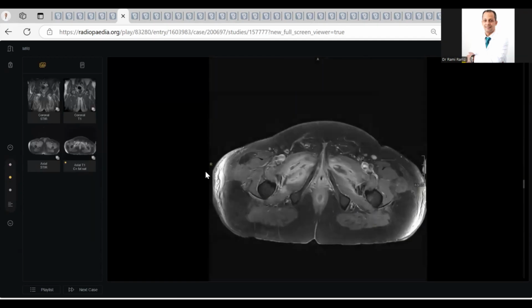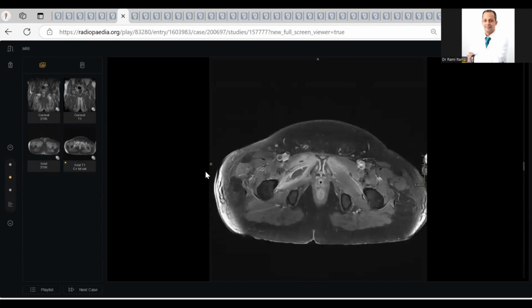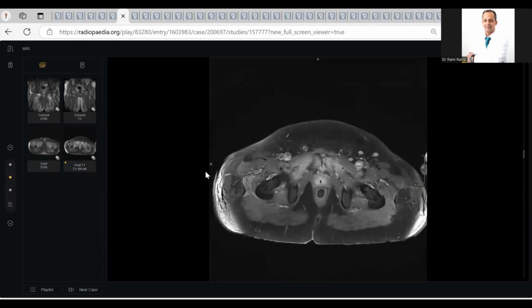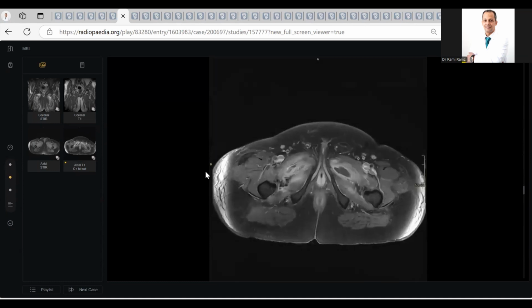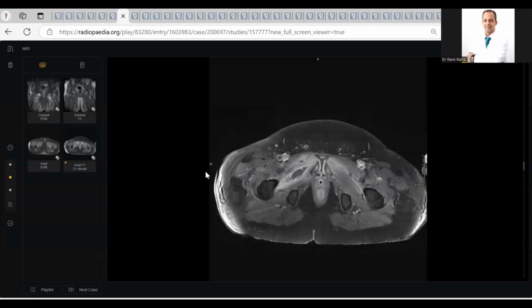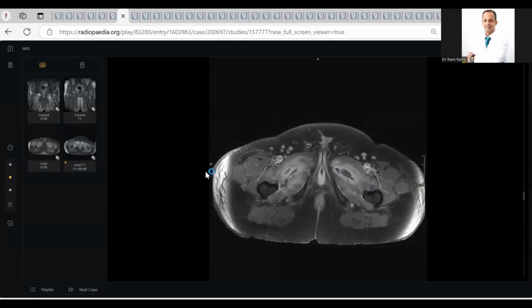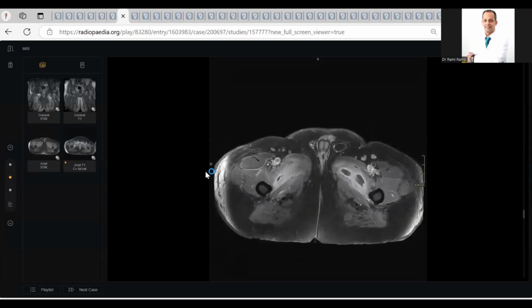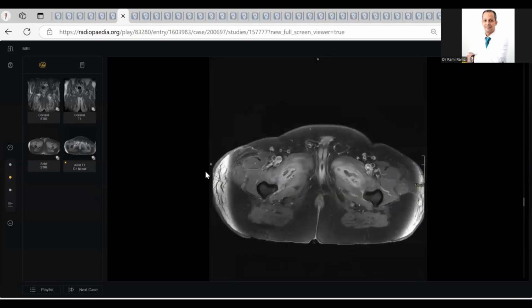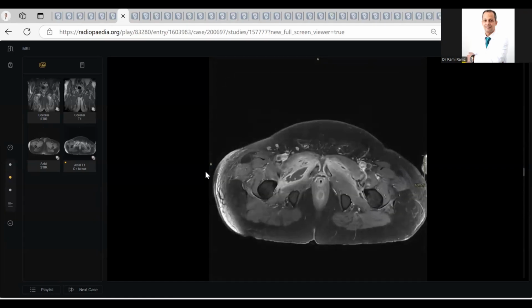and this is a post-contrast T1 fat-SAT MRI of the pelvis showing septic arthritis of the symphysis pubis associated with bilateral peripheral enhanced fluid collections in both adductors. Your diagnosis was correct, she made it as septic arthritis complicated by bilateral adductor abscess. Thank you, doctor.